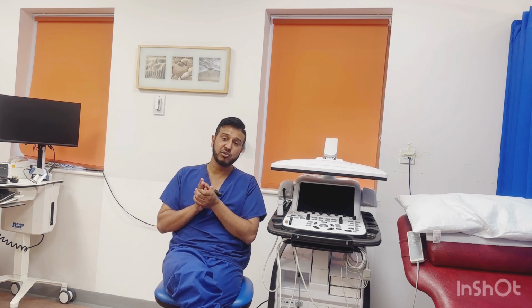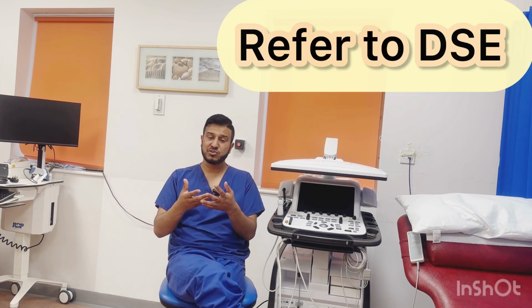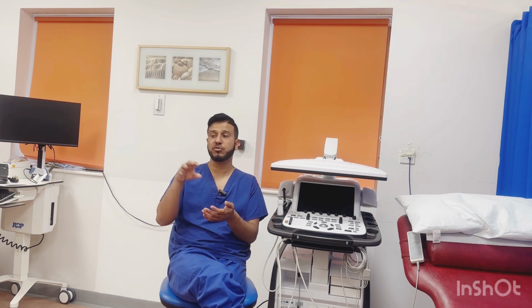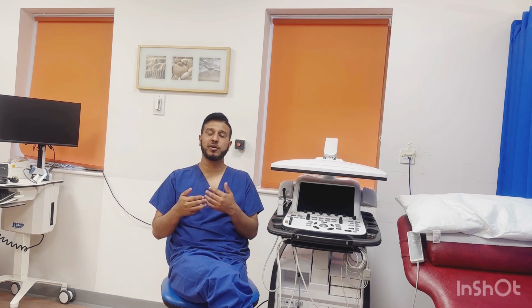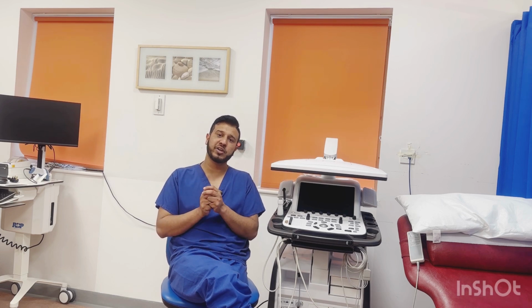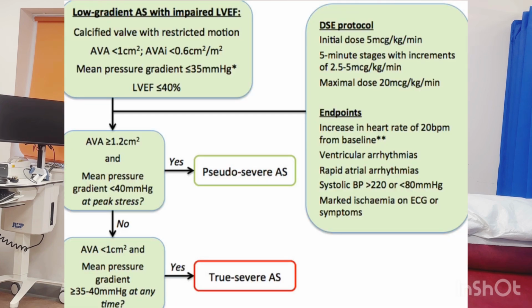This is called reduced EF, and you should send these patients for dobutamine stress echo to exclude whether this is a true severe aortic stenosis or maybe a pseudo severe aortic stenosis. You will report it as classical low flow, low gradient aortic stenosis, and you should say that dobutamine stress echo should be considered, the same as in the European one.